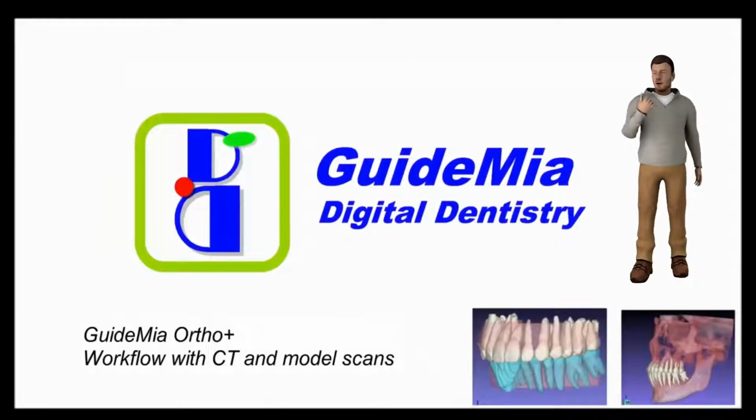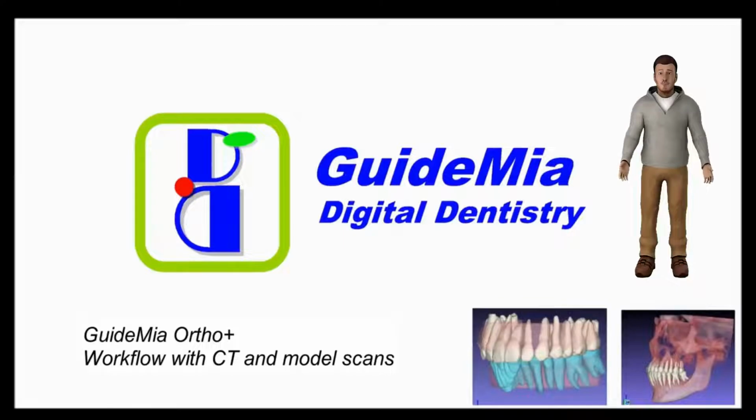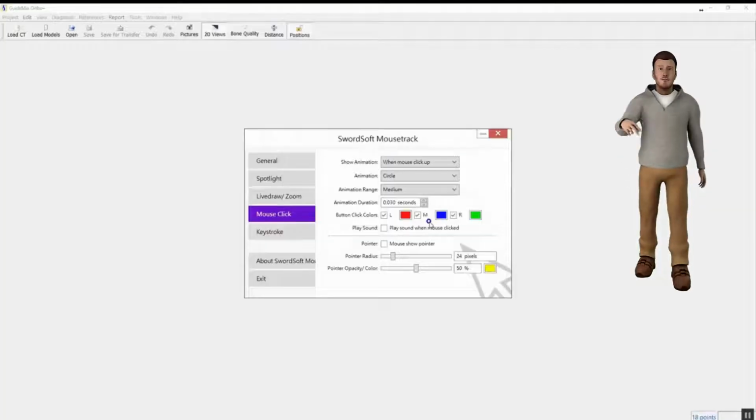I am the CTO in Digital Orthodontics for GuideMia Orthodontic Digital Project, and in this demo, we will use GuideMia Ortho Plus software to perform treatment planning. In aligner design, the case has a patient's CT scan model, face scan file, and X-ray panoramic picture.